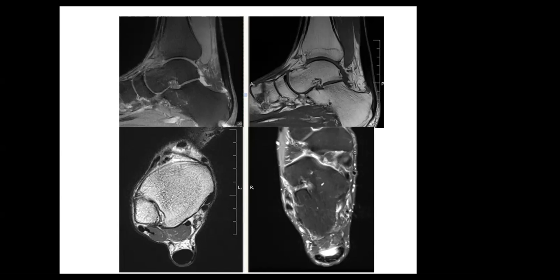It could be a chronic tendinosis of the Achilles tendon. There's no bone marrow edema, no bone lesion. Actually, that's my finding: thickening of the Achilles tendon, no rupture.